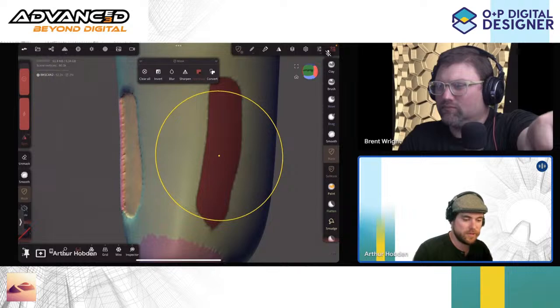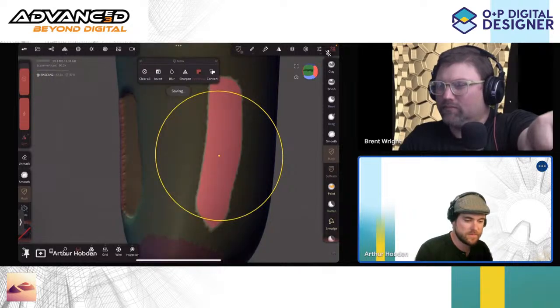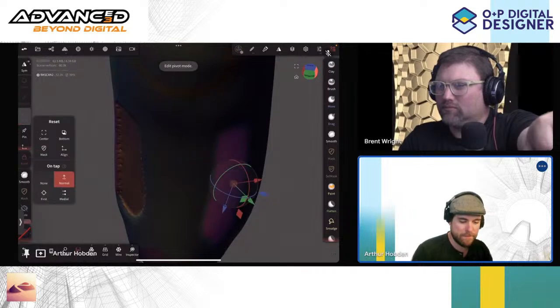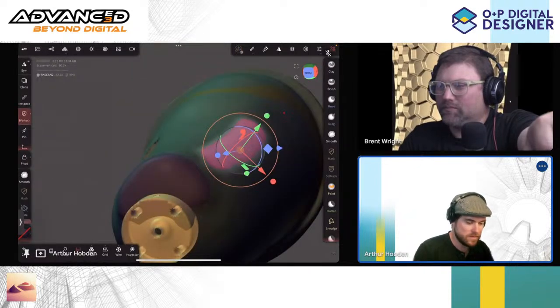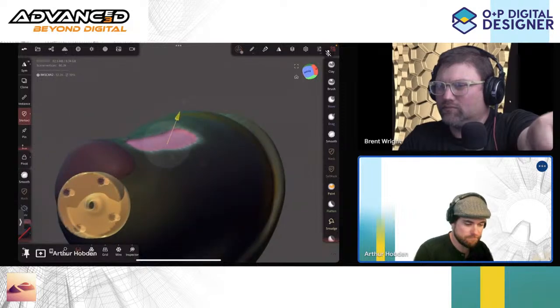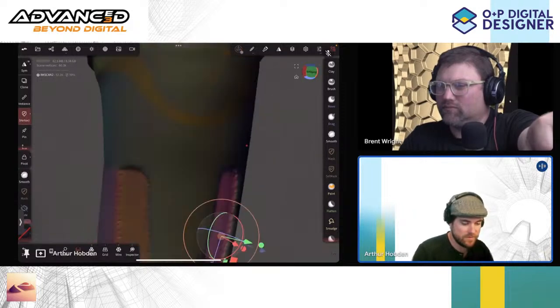And this one as well, reload. Yep. Align on tap. And let's bring that in a little bit. So 2-3 millimeters.